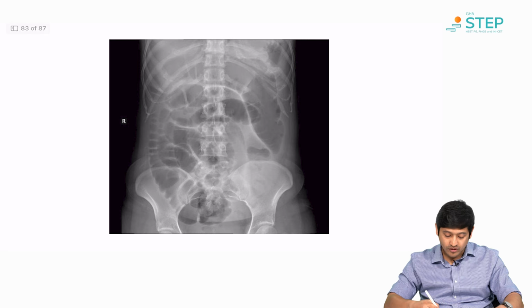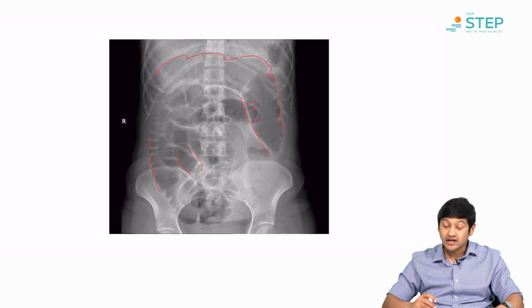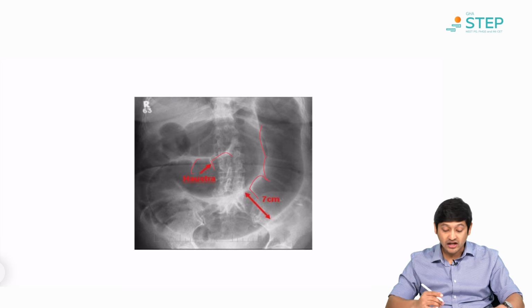Another example of a small bowel dilation. So here you see some segments of featureless bowel. Here you see mucosal folds, and you can also see large bowel here with its haustra. Alright, so different haustra in the abdomen. This could be a large bowel obstruction. Similarly, when you see haustrations like these folds along the wall, this becomes large bowel obstruction.